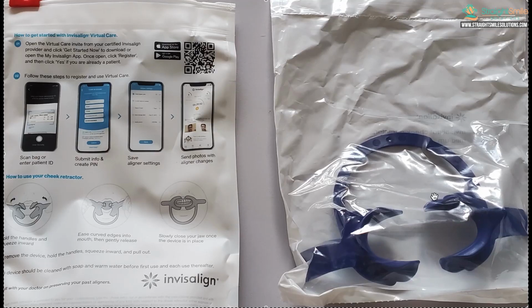I don't know whether you can use any retractor with this, or if you have to buy one for patients. So you guys are going to have to check that out. I think you probably can use whatever you want. But initially, when we first took the course, they told us to have the patients use spoons. So I'm assuming you don't have to buy this, but then you're going to need to set it up on your patient's phone. Here are the instructions. That would be the easiest way to do it, before you deliver the appliance.